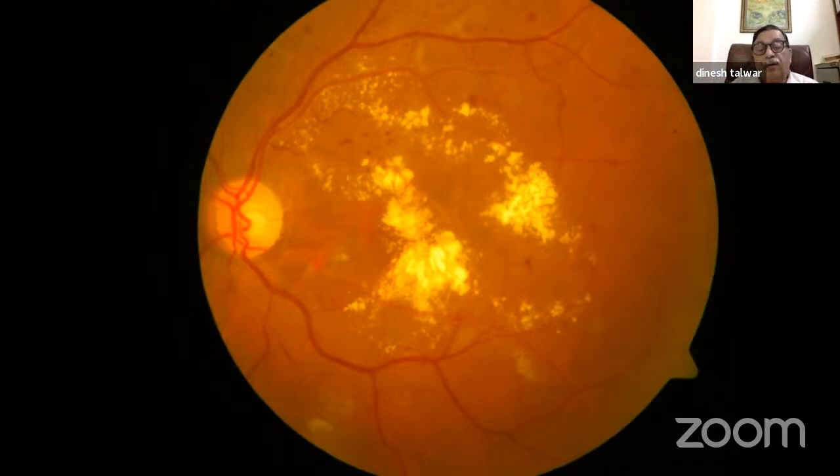I've already told you that on your fluorescein angiography, you find out whether there was neovascularization, and you also get to know whether there are multiple focal areas which you can laser. But even to laser that, you'll first give anti-VEGF treatment, bring down the edema, and then consider the ones which are left as leaking spots, whether you want to do laser for them. And then subsequently, again, you will go back to anti-VEGF agents.